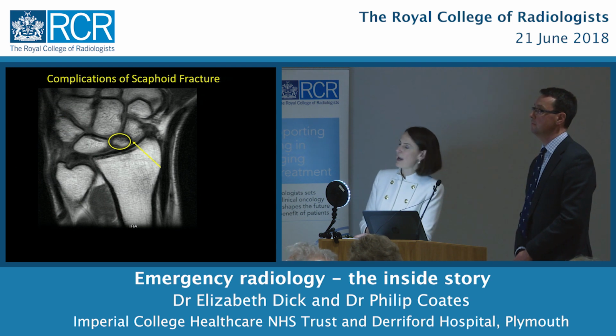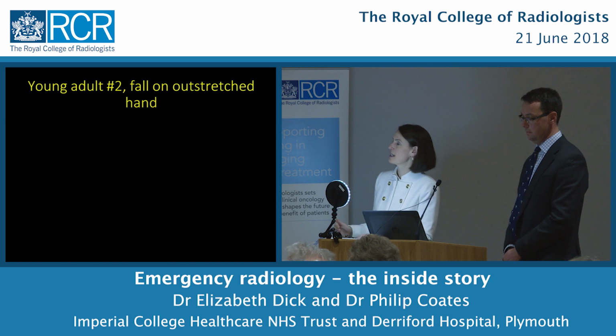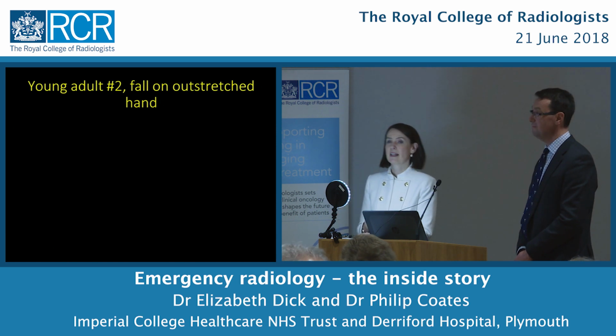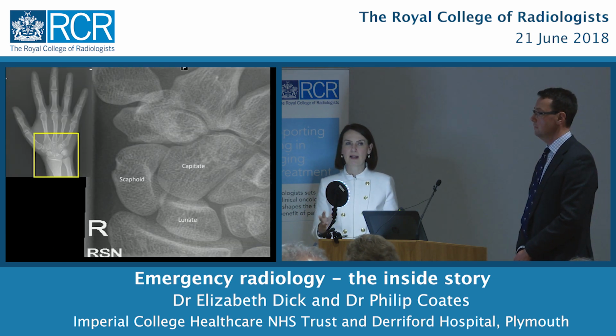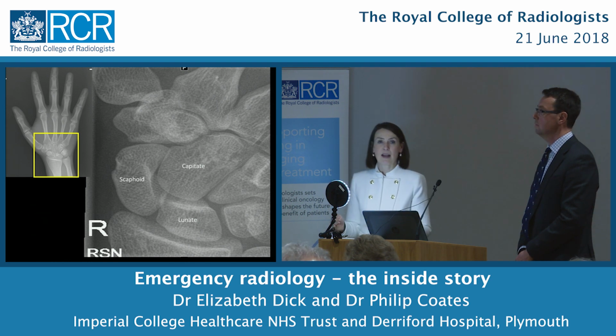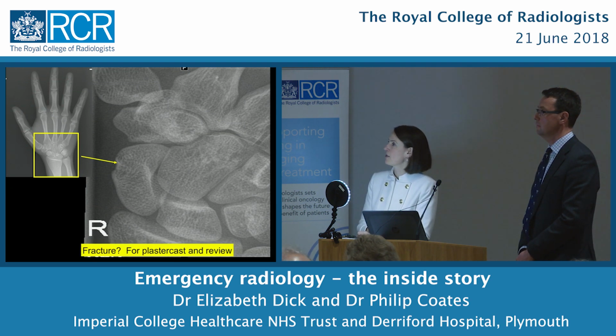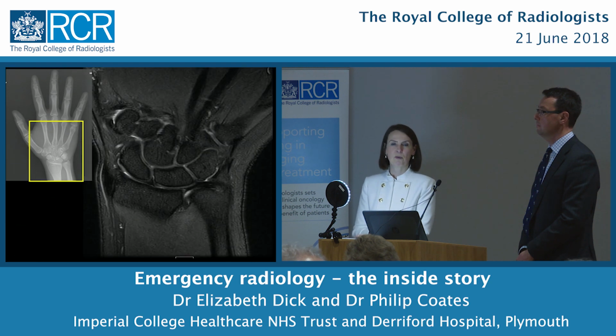Okay, so here's the next patient, also fell on almost exactly the same history. Fell on his outstretched hand, he's got pain, and here's his x-ray. Now, because we'd just seen the last patient, we were hyper alert. We thought, I think I can see a fracture here. And the MRI was still open, the radiographer hadn't gone home, so she very kindly agreed to do another MRI. And here's the MRI on this patient, completely normal.